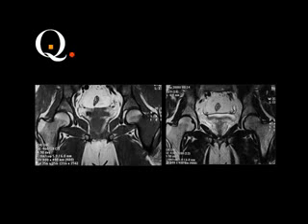Okay, marrow infiltration. Okay, you consider lymphoma. Let's look at the femoral neck and the shaft and the T1 on both sides. You got almost similar lesions, but this is more black than this one. Okay.